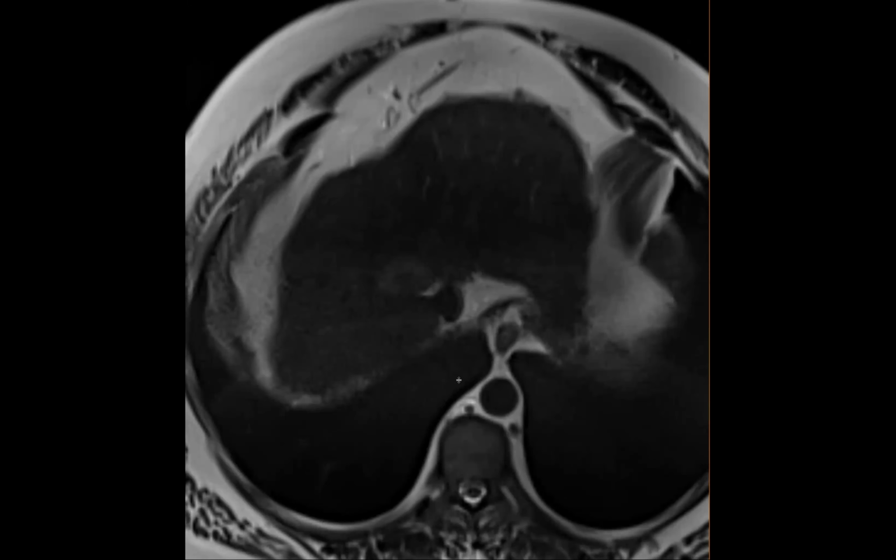That's a really great question. In my gut, I was actually thinking cholangio, but it's not rim enhancement, it was enhancement without washout. So I feel like I would have had to call it LR4, which maybe doesn't matter, because in some places LR4s are all biopsied and this one had enough concerning features. Yeah, I think based on the enhancement, you would have to call it an LR4. Arterial enhancement. And then biopsy, of course.